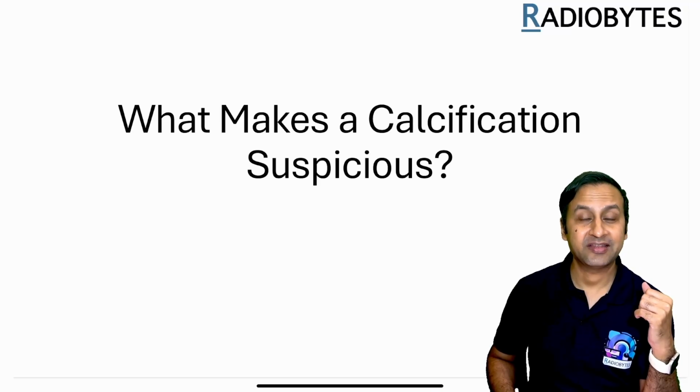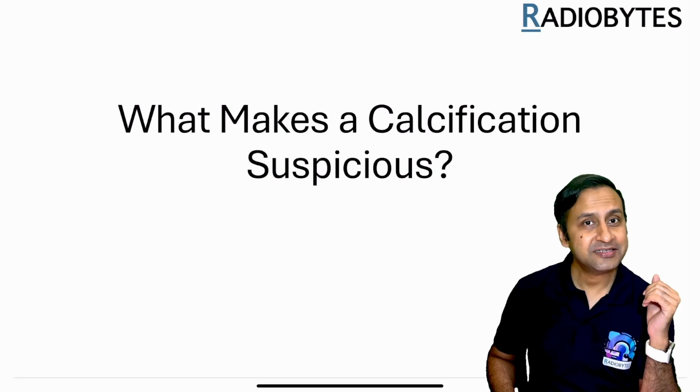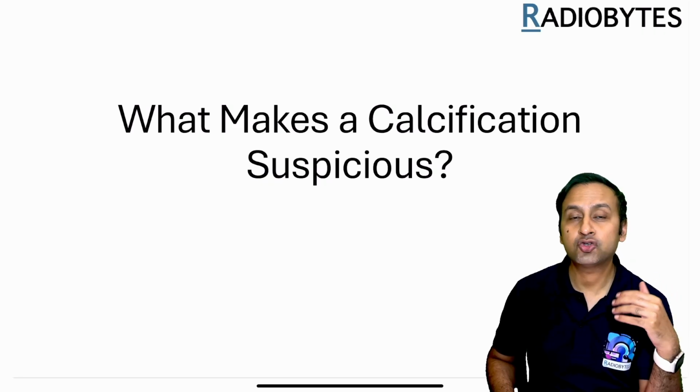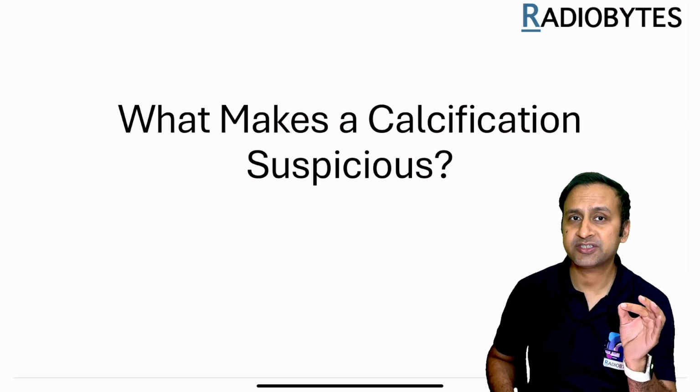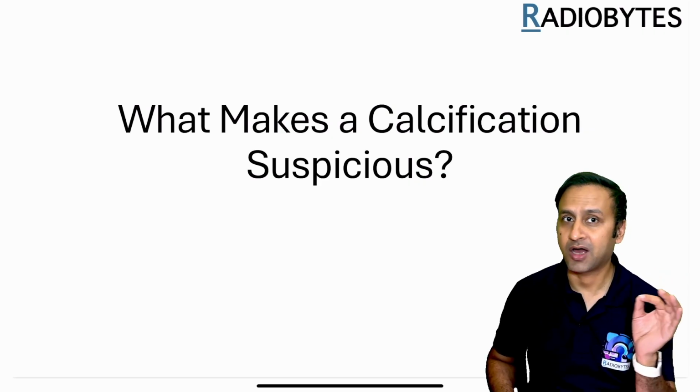Hello friends, in the previous session, we learned how to detect calcifications on a mammogram. In this session, we're going to go one step ahead and I'll be talking about all those features which help us in identification of suspicious calcifications which have a risk for harboring malignancy.